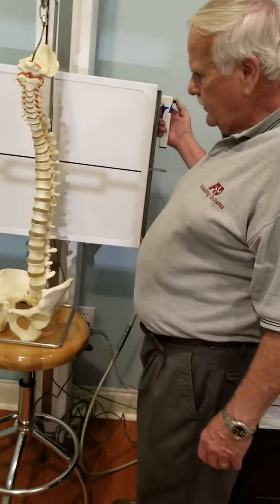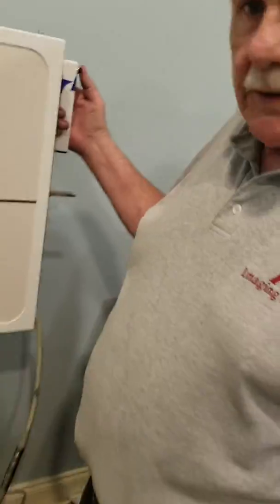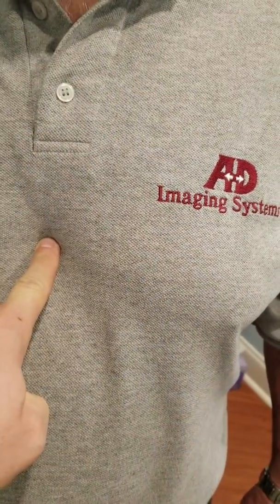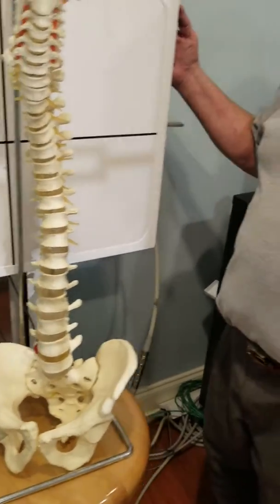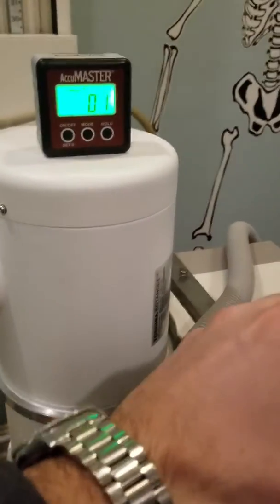So I guess first we have to line up the crosshairs with the patient. So we're going to do that at approximately the xiphoid process, so at the very bottom of the sternum. So on the patient, that would be right about there at the very bottom of the sternum. But on our plastic model here, we're just going to pick T8 as a good starting point. Okay, so that's set. Now you got to angle up 10 degrees. Now that we've got the height of everything set correctly, we're going to adjust this to a 10-degree upward tilt.